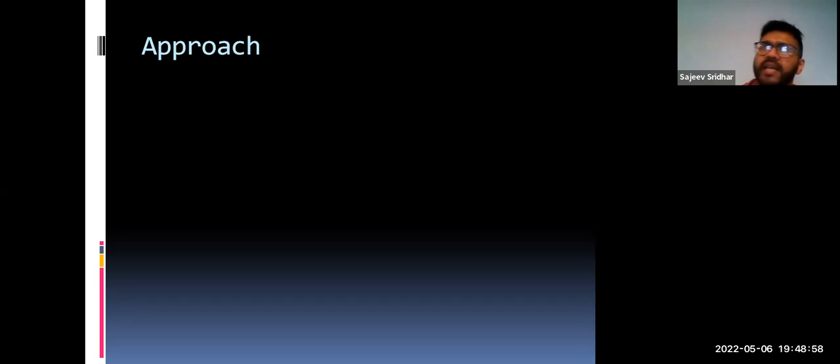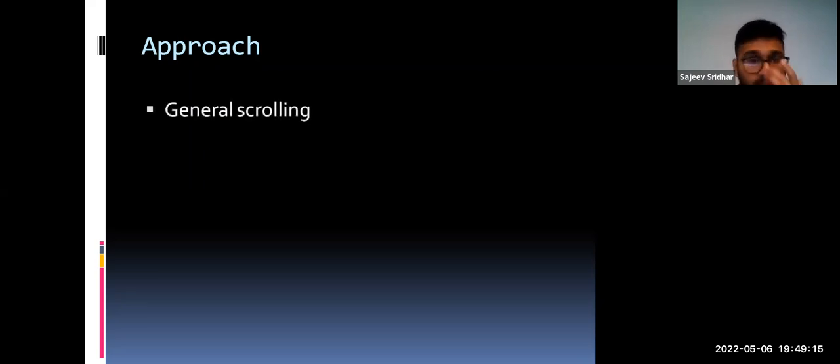And it'll also give you a good idea of if there are any pathologies already with the CSF, because if the hemispheres are not symmetrical right from the top itself, then you know that there is something going on. There's something unhappy in the brain. First thing that I would always recommend doing is scrolling. Scroll up and down really, really quickly, just to see if anything catches your eye. It allows you to point out if there are any masses, any bleeds, anything really quickly. If nothing pops up, then start to look at specific things.